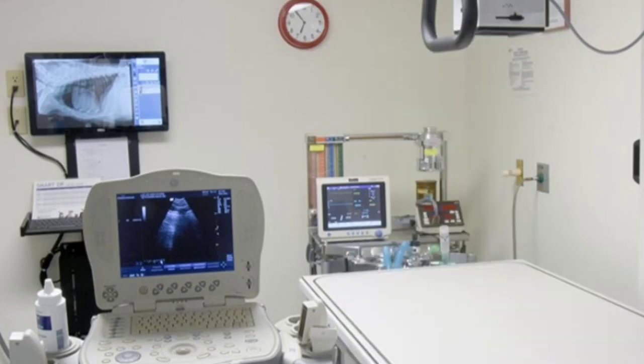If you put a Doppler signal on the tumor, you will either appreciate no vascularity or maybe very rare or sluggish vascularity. Hypoechoic metastases are from the gastric tumor, from the pancreatic tumor, and from the esophageal cancer. So these three tumors can cause hypoechoic mets. Those mets which are not treated, especially mets from the lungs and from the breast, if they remain untreated, will also appear hypoechoic. Non-Hodgkin lymphoma also appears hypoechoic.